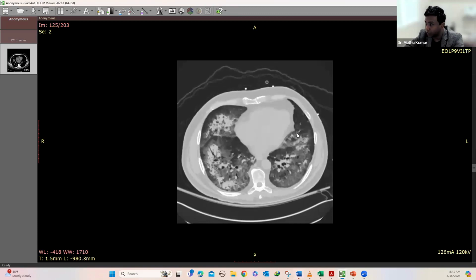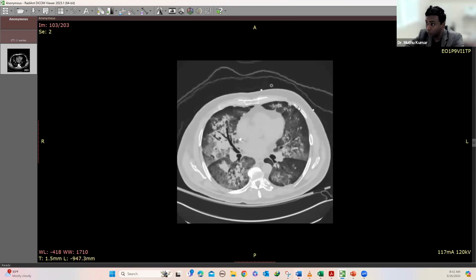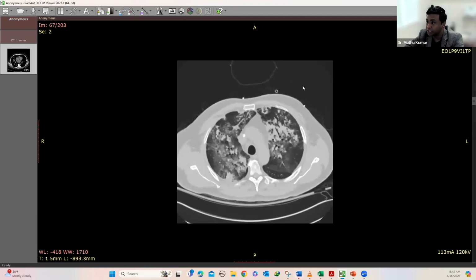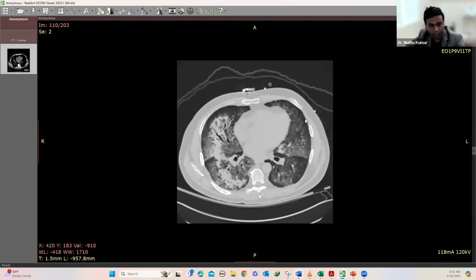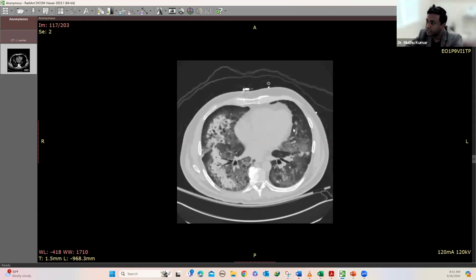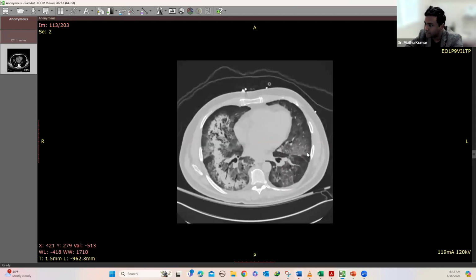In this 45-year-old patient with low hemoglobin and hematocrit with repeated episodes of pneumonia, which was called pneumonia, I went through the other charts and that was not pneumonia, that was vasculitis as well. So when I scroll through it, there is some ground glass and there is mass-like consolidation, there is septal thickening, there is low hemoglobin, low hematocrit.